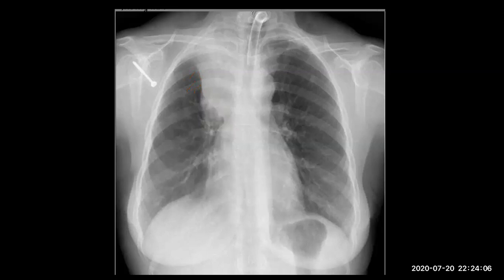Is the position 5 cm above the carina? It's normal. Okay, the position is relatively okay. Anything other than this? Nail fixation in the right humerus, right humeral head. Okay. Other things?